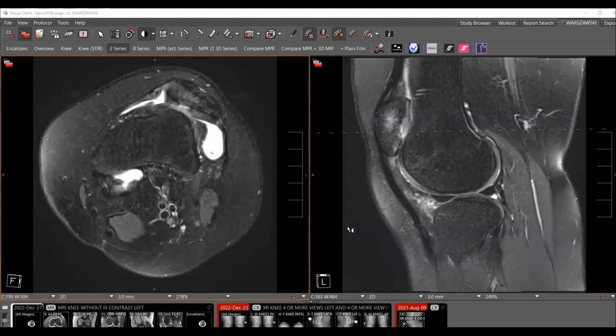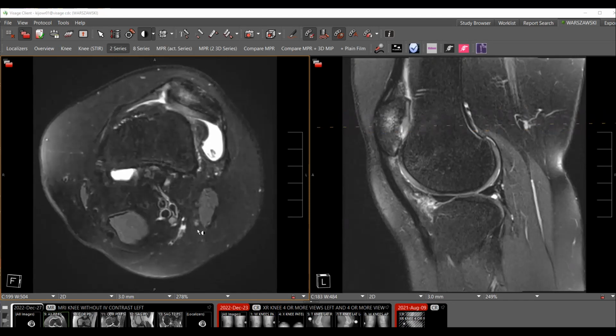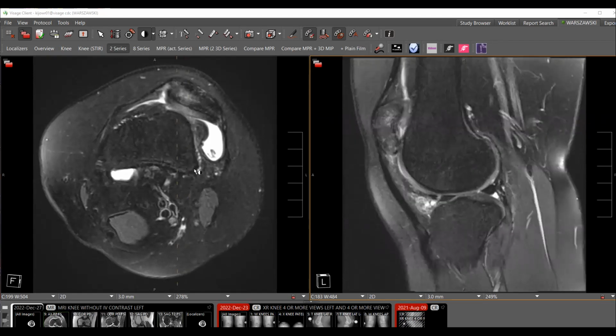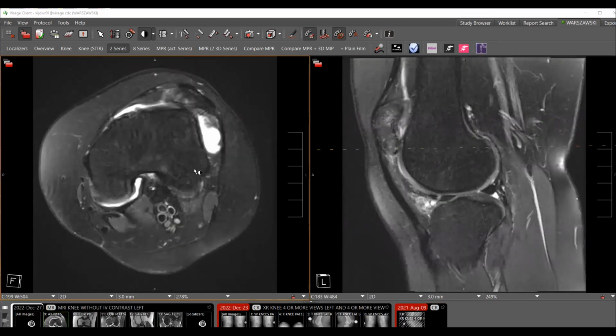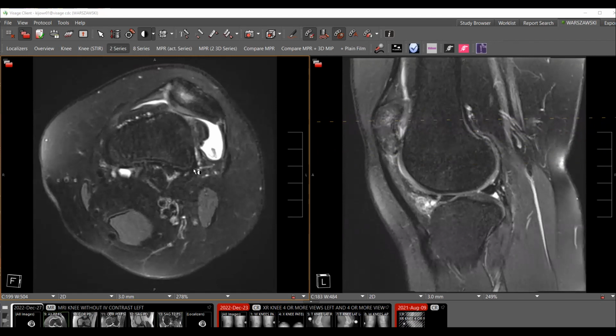Cartilage delamination is typically caused by shear injuries to articular cartilage, as in this case. And the cause of this patient's cartilage delamination is transient patellar dislocation. Notice the patella alta, the dysplastic trochlea, and the lateral subluxation of the patella in this individual, with an associated intra-articular cartilage fragment in the lateral suprapatellar pouch.